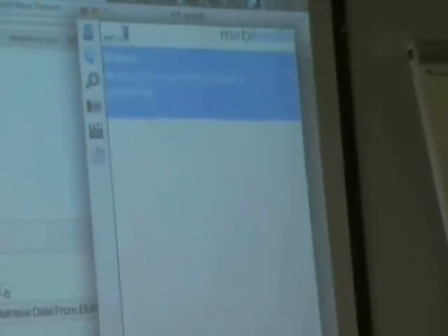starting the MobiGuide system, and now this system, the mobile, is sort of less empty. It's waiting to be enrolled, waiting for enrollment into a guideline. So now when John presses enroll, it will retrieve the data from the PHR, fill up the caregiver interface, notify ERS, and send it to the mobile. There we go. So you heard it already. We got the start treatment.